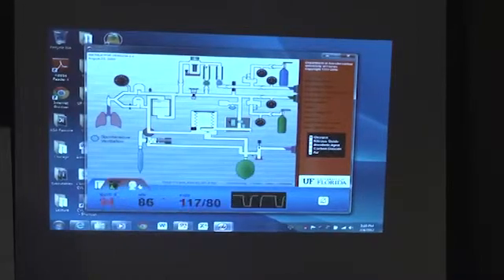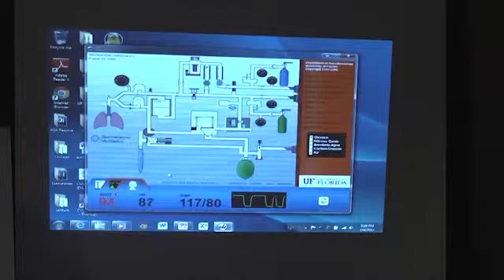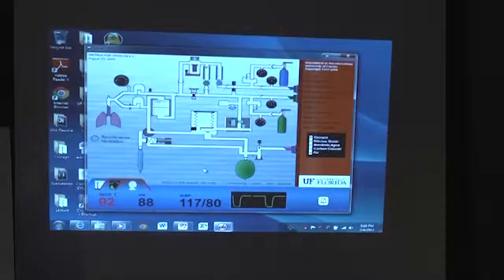Make sure. So now I have a second alarm. What is that second alarm? The pulse oximeter is giving an alarm, right? So what does that tell you about the oxygen analyzer sensor? Are you now feeling more confident? Yes.